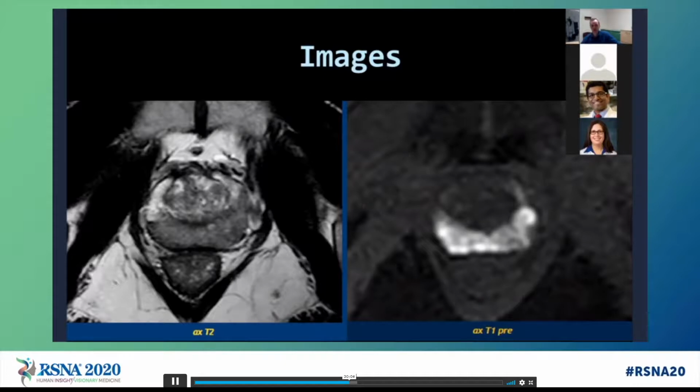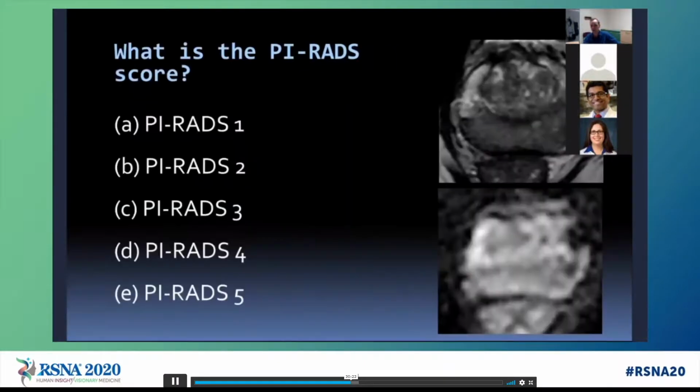Luckily, the diffusion weighted imaging doesn't tend to be as affected, so you can rely on that a bit more than the T2 and potentially DCE. DCE can be problematic if there's already high signal pre-contrast, but you can use subtraction techniques sometimes to try and see enhancement. But yeah, challenging when you have a lot of hemorrhage around.